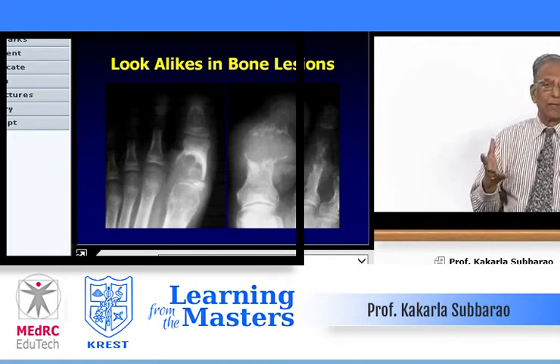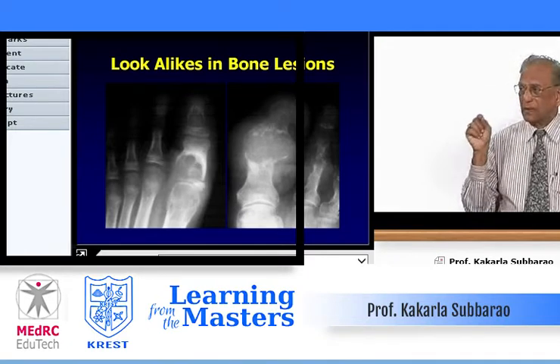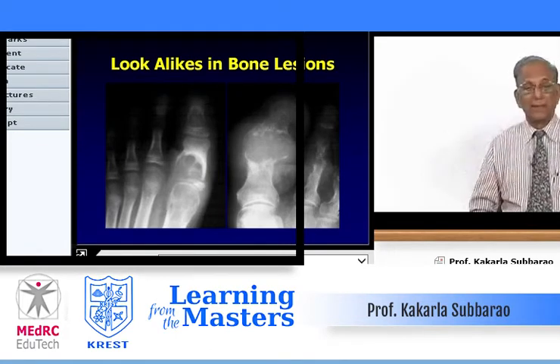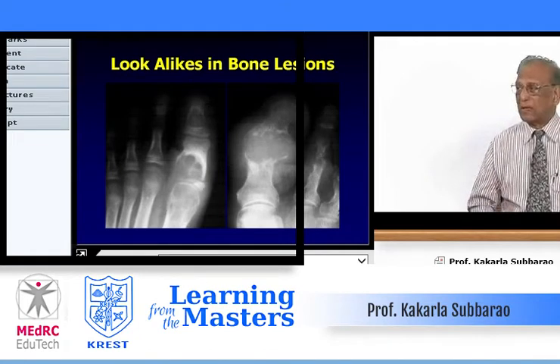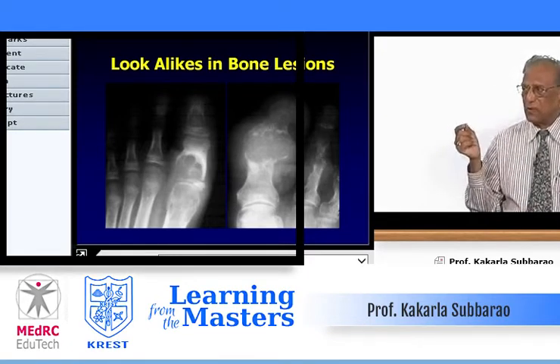benign neoplasm or a malignant neoplasm. Obviously it is slow growing because there is a reactive new bone at the sclerotic border. On one side it is slow growing, and the other side is a little aggressive, going all the way to the epiphyseal plate. And then in the center, there is thick bone. It's not just residual bone trabeculae, as if there is new bone formation.